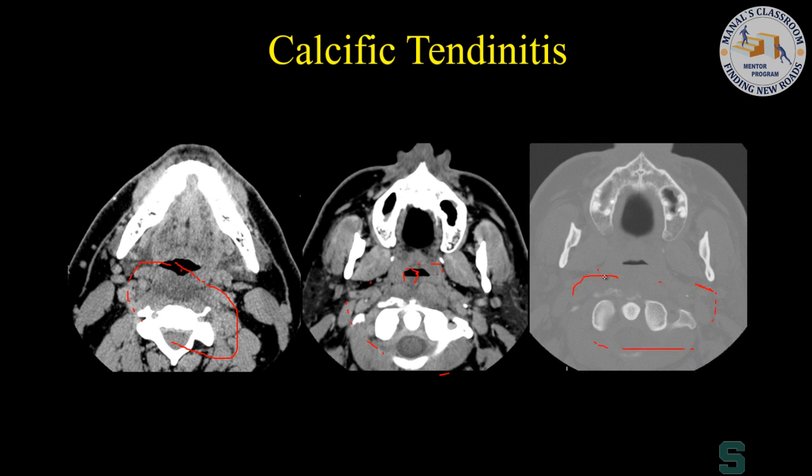Normal or abnormal? Is it abnormal at A, B, or C? A. Yeah, right there. See those calcifications? So that's calcification involving the longus colli muscle. Again, it's there. When I first put this talk together, I'd never seen this before. Then I went back and looked at my reports and I missed it. So there's my experience coming through again.